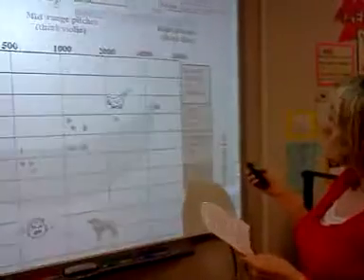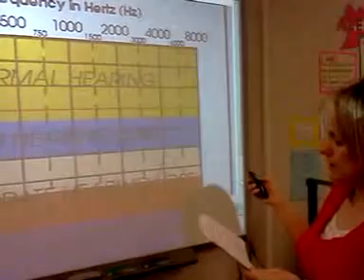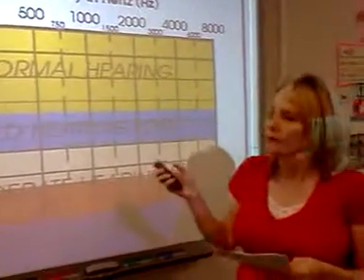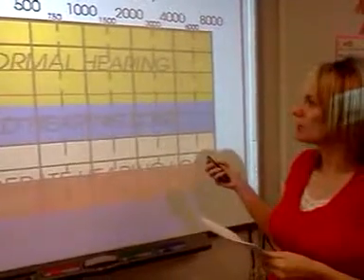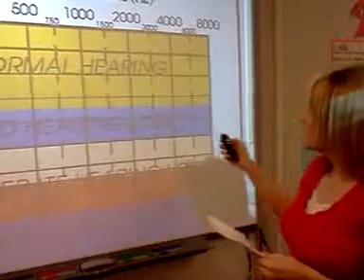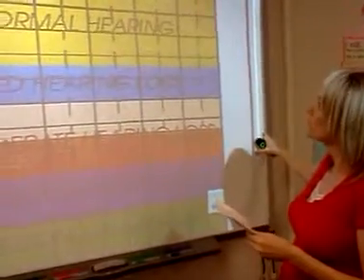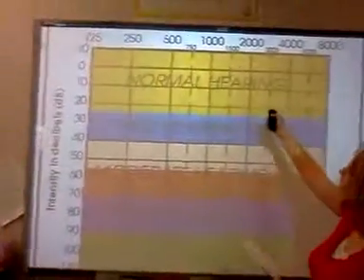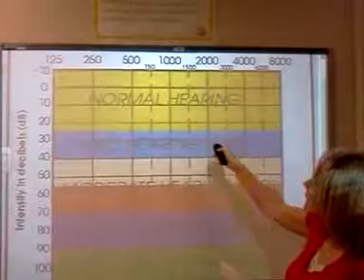Okay, next I'm going to provide you with a summary of your child's hearing levels, after I explain what the degree of hearing loss, the type of hearing loss, and the configuration of hearing loss mean. First, when we're talking about degrees of hearing loss, we are talking about how much hearing loss a person has. Normal hearing is 0 to 25, and it's represented in this yellow area.